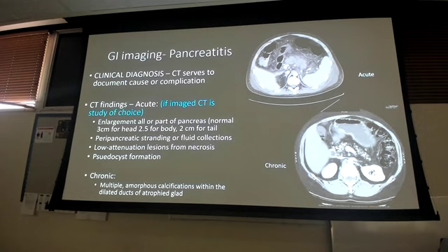On x-ray, I would have to, unless it's a large bowel, because we didn't really talk about large bowel ileus. But for small bowel, yeah, I have to give you something, because they look very similar. They both have dilated bowel. They both have multiple loops. They both are going to present the same from the image. But then there were very specific things that make you ask, do I think this is ileus? Do I think this is obstruction?